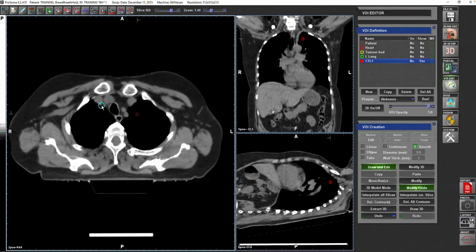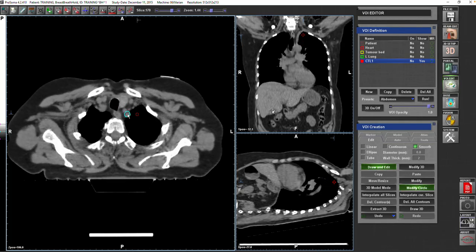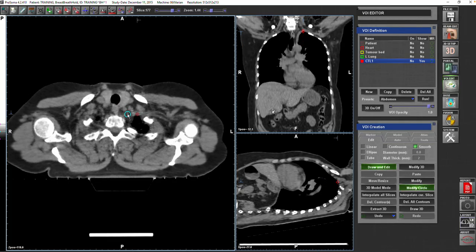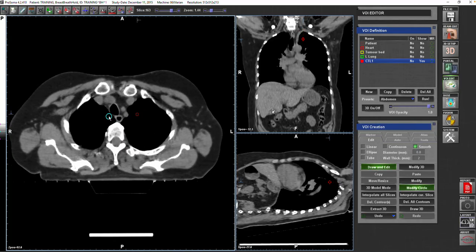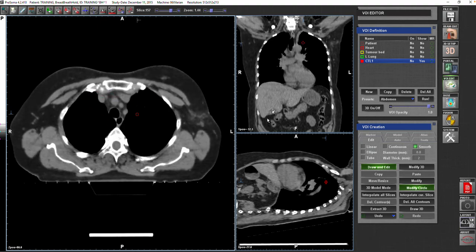One is coming from the brachiocephalic high up, and the second is coming directly from the left subclavian, from the arch of the aorta. So they are at different levels, and this will make the internal mammary delineation on the right side a bit different from the left side. So don't be surprised by that, but you need to familiarize yourself with that.